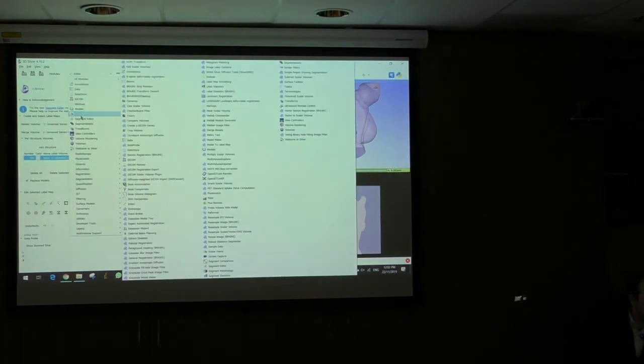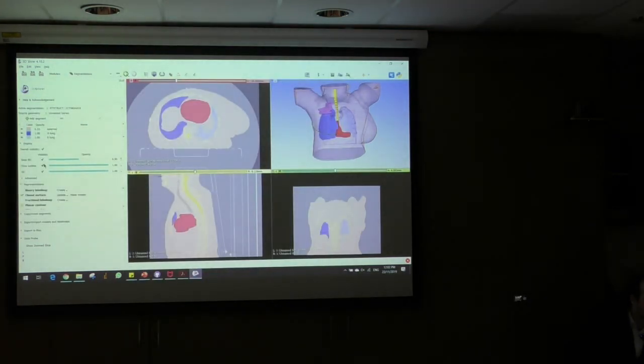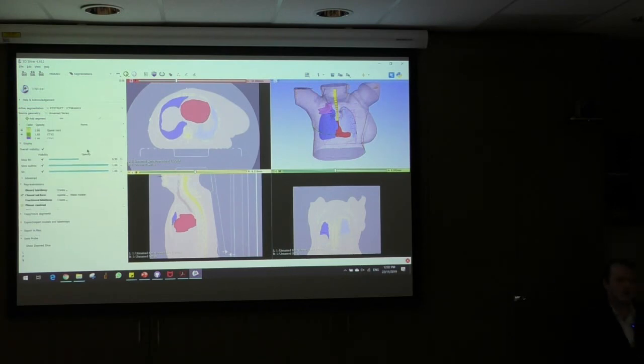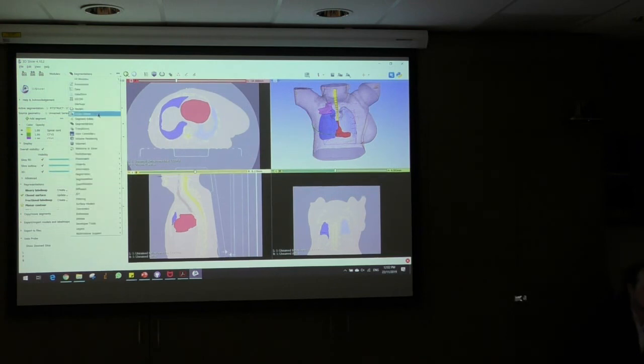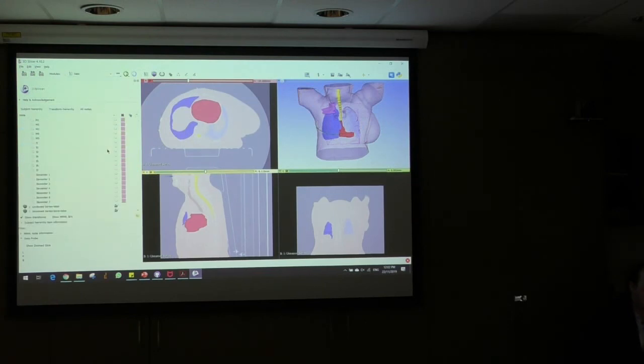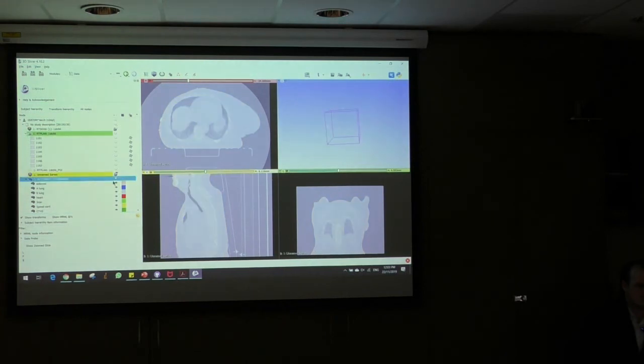I don't think it's in this one. Sorry, segmentations perhaps. There is a way to set that. I was looking at that earlier. Yeah. No, there is a way to do it. Was it segment editor? I wouldn't be able to remember how to do it. Sorry. Yeah. But there is that feature there. So that's that point there. So what I will do now is just, yep.